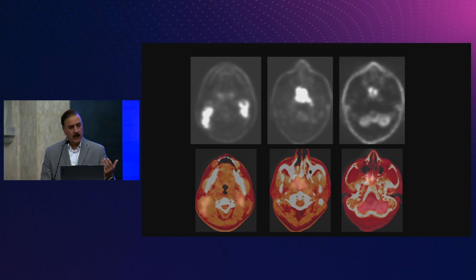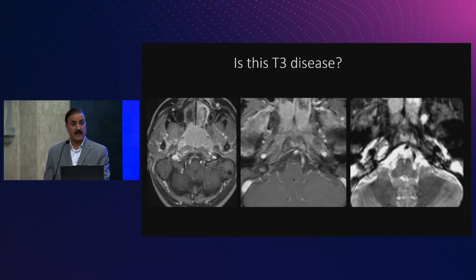Because we know from history that in the oral cavity cancers, especially the lateral tongue cancers that are very close to the cortical margin of the mandible, we do sometimes see some changes in the mandible, and when they go in and scrape off the mandible, the biopsy comes out to be negative, no cortical bone involvement. So there are possibly some reactive changes that we pick up on MRI, which are not in fact tumors. But in the case that I showed you, I don't think there's anyone in the room who would not have called this clival involvement.